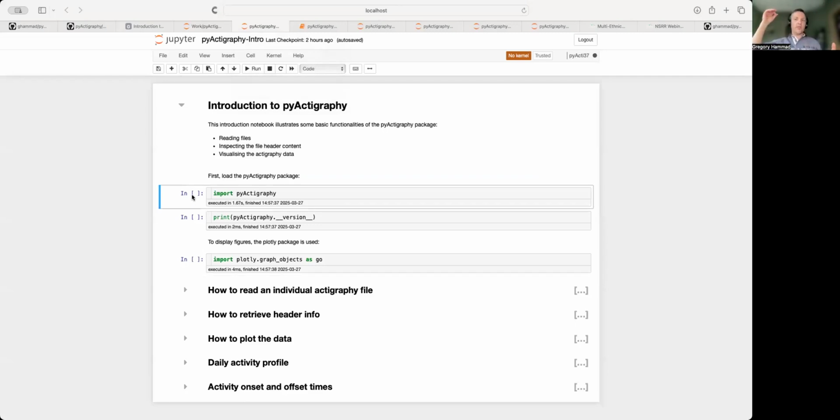A notebook is like a self-contained object with different cells where you can type code. You can also type some instructions, comments, and text. You can also display images. So it's actually a nice way to have a narrative of your analysis. And it's interactive, so you can easily practice. You can directly see the output of each cell as it is executed. At the end of the day, if you have an analysis, you may want to have a full script. But to practice, to play around with the toolbox, it's always nice to have something interactive. So I think notebooks are great for that.